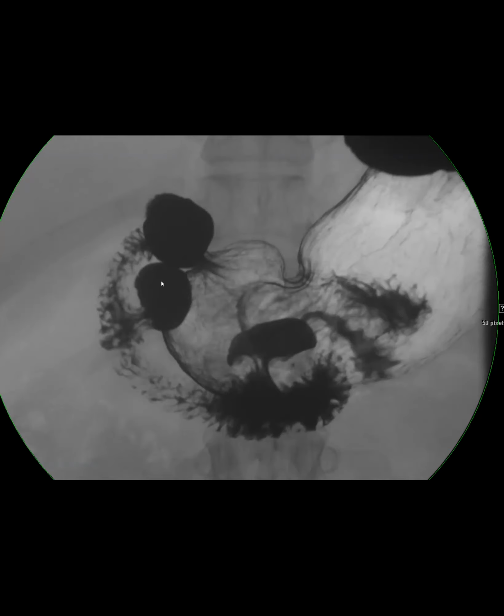So basically these periampullary diverticula are usually incidental. 90% of them will be completely asymptomatic. However, in some cases, you can get a bezoar in here. You can actually get the common bile duct inserting on it, which can be hard if you're doing an ERCP to get into the common bile duct. And if it gets a lot of debris, it can impact and cause common bile duct obstruction, and that's called Lemmel syndrome. So anyway, this was just a cute case of a couple of tics.